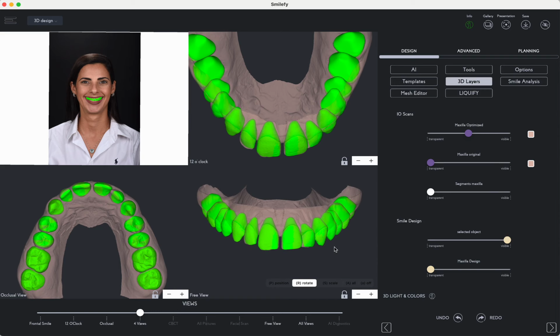patient's teeth. Right now they are just generated, but if you have the CBCT file, you can bring the CBCT file into the project. We have the roots of the teeth, and then you can move the teeth and decide where they should be, so you can do intrusion, extrusion, rotation, and changing position mesially, distally, realign the teeth in the way you want.